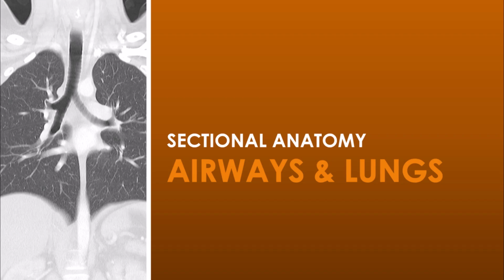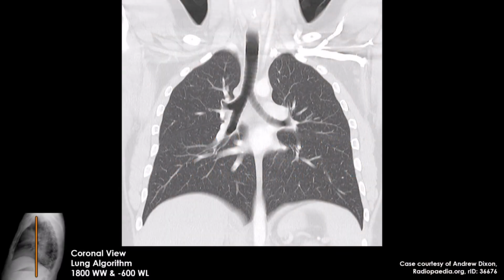Hey everybody, welcome back. This lesson is about the airways and lungs as seen in CT imaging. We'll start with a coronal image. This is a coronal reformation of the chest. The image has been processed with the lung algorithm to increase spatial resolution and demonstrate the finer details of the airways and lungs. Notice that the windowing technique is very different from what we've seen before.